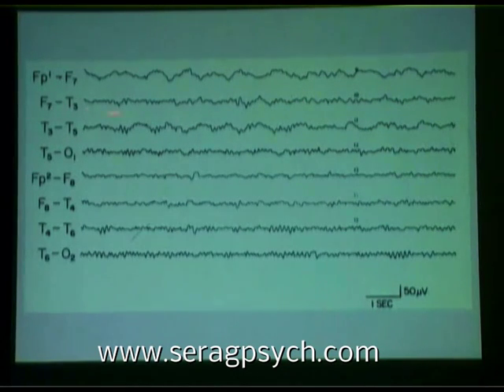In other words, if you're suddenly looking at an EEG with delta activity on it like that, and you miss the beginning and the middle or the whole seizure itself, and that's all you see, that's not very good. It's much better to have the seizure. But this gives about 9 chances out of 10, or more than that actually, that it's localizing to the onset.